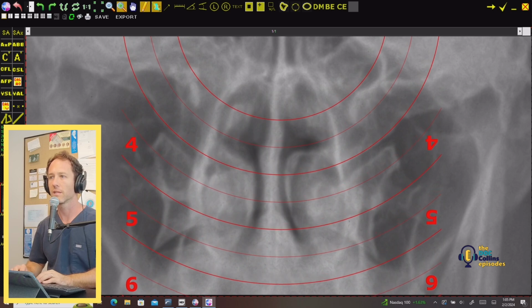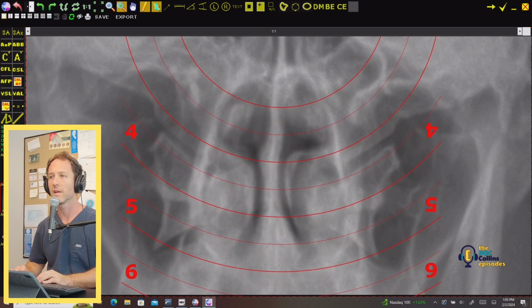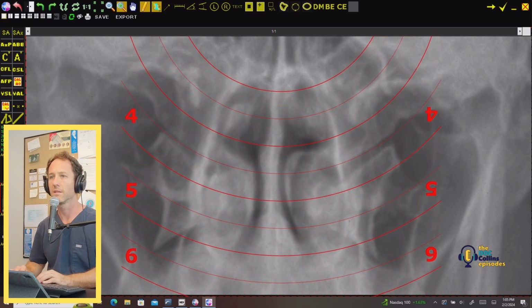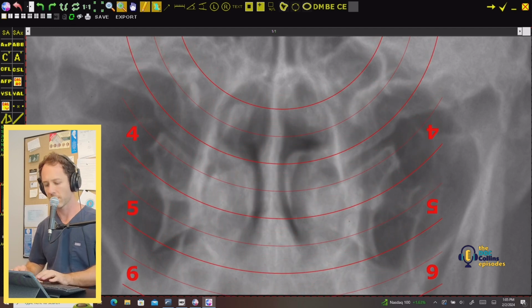And if I look at this 3 circumference, it's not doing the trick. These condyles are a pinch flatter than that 3, and that 3.5 was too flat, especially with that one on the left. So I would split the difference, and I would say 3.25.